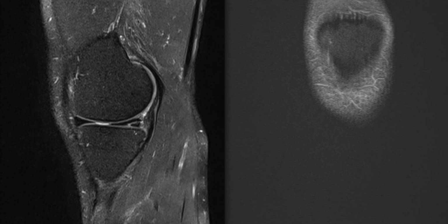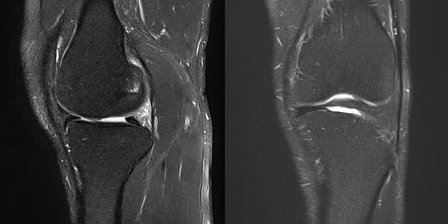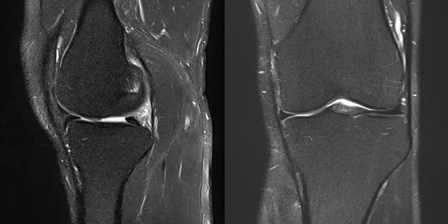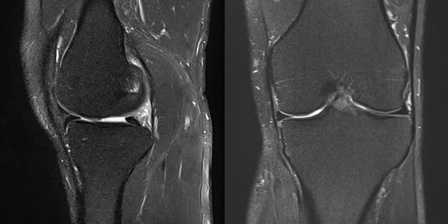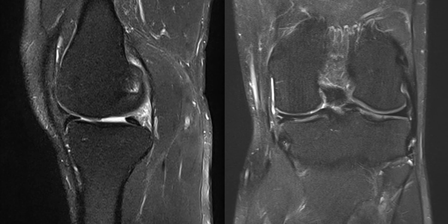In this last case, we can see that this patient has a simple horizontal tear of the medial meniscus, but as we scan centrally, we can see that there's blunting of the rim of this meniscus. And again, this is a very characteristic appearance in patients who've had surgery, but in patients who haven't had surgery, once again, this should be a prompt to look very carefully in the recesses to see whether a fragment can be detected. And here we can see that there's a small fragment of the meniscus displaced around the tibial rim.